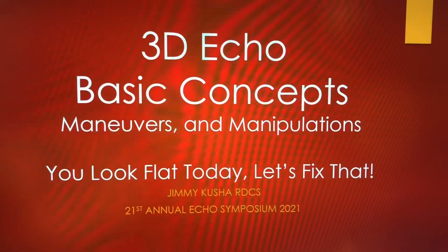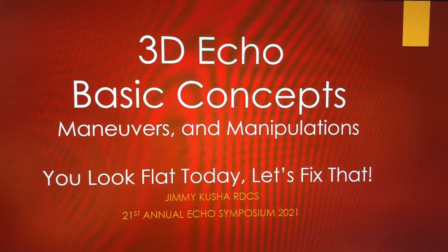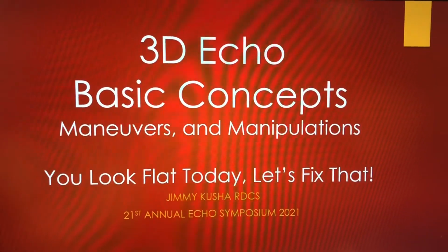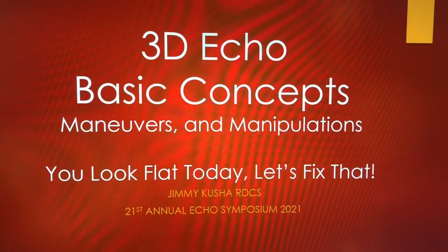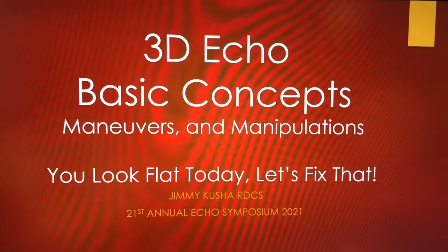Specifically with the Philips Epiq systems, but the general principles apply to every other ultrasound machine. So hopefully this will help enhance your practice and give you a deeper understanding of the world of 3D.